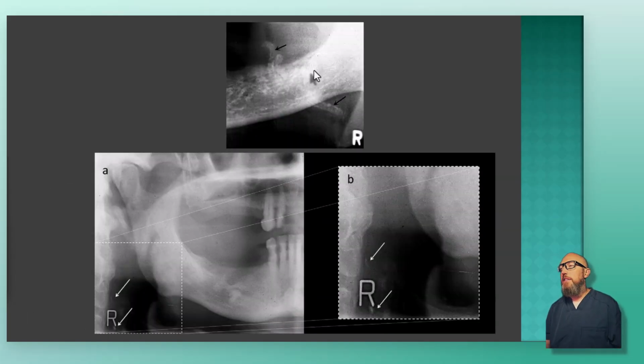What does that look like? That's a mandible, cropped panoramic image, something crossing the body of the mandible. And so that's facial artery calcification. Does it look more like the medial or the atherosclerosis? Well, it's more the tram track, more the medial arteriosclerosis. And then here for comparison, you have this irregular calcification in the posterior neck, right around the level of C3, C4, and that's your atherosclerosis.